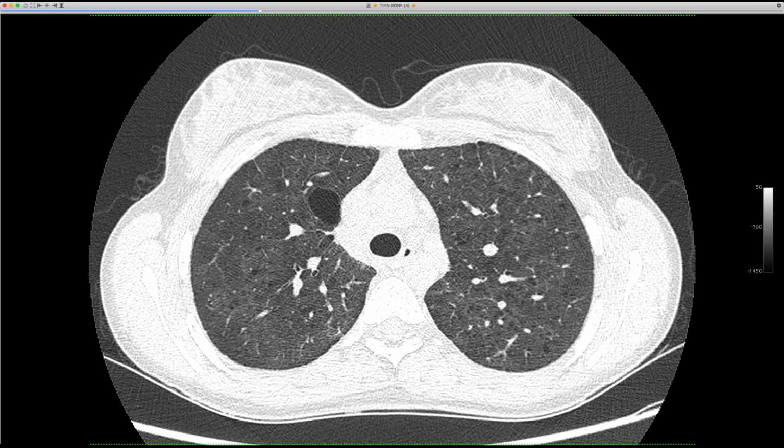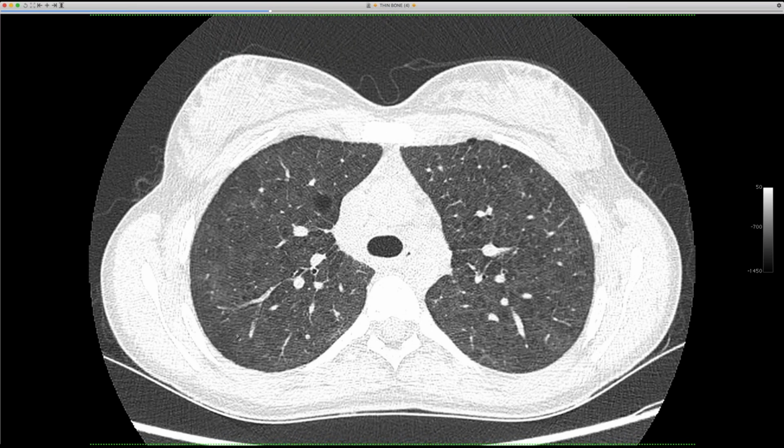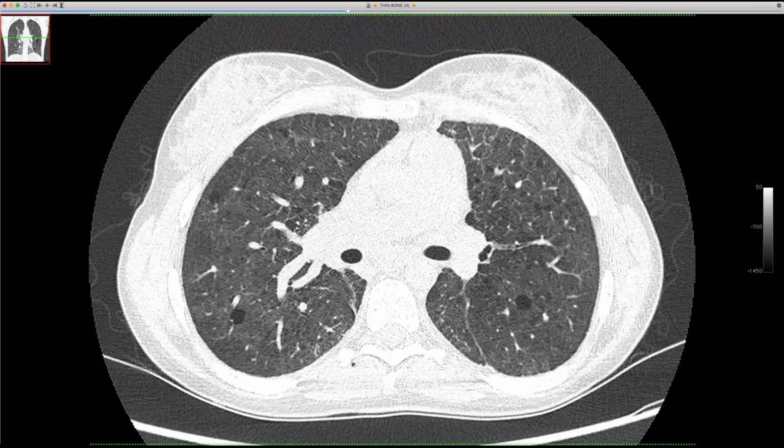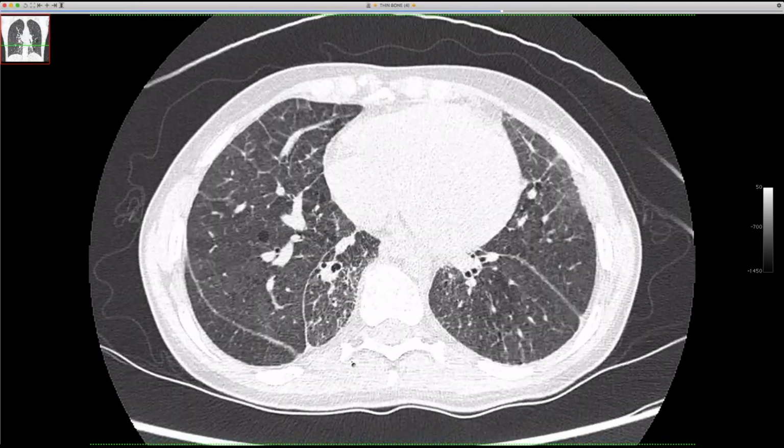Yeah, and I think it's a mixed picture, but I think the changes over time have been really the lower lobe volume loss, and that's mostly accounting for her progressive restrictive physiology. And so I think we ought to worry about amyloid too with lung cysts that are basal predominant. Yeah. As far as I know, she doesn't have a plasma cell dyscrasia, but you're right. I mean, to me, it's indistinguishable from LIP when it's just cysts.